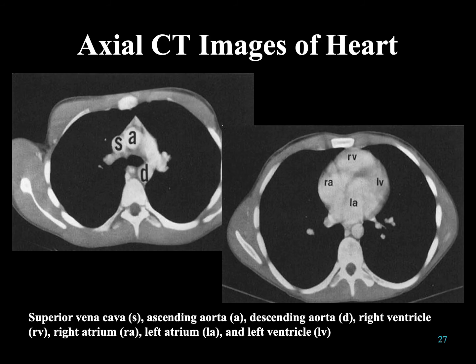And then you can look at the CT scans. You can look at an axial portion as we go down a little bit lower in the chest cavity. You can see the atrium, the ventricles here.